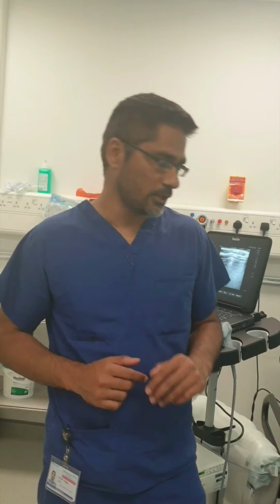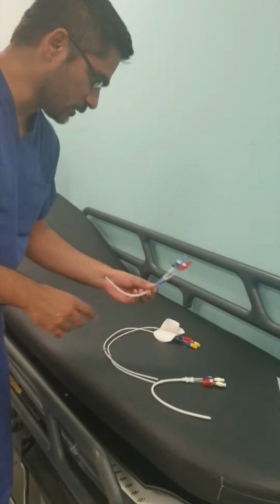This is an introductory video for central access for hemodialysis, and this is mainly intended for the junior doctors who can come across hemodialysis patients in their A&E or in acute wards. The purpose is just to get familiarized with the types of central access. I hope you will learn from this video. Let's watch the video.